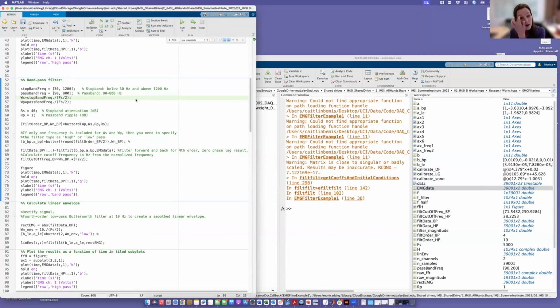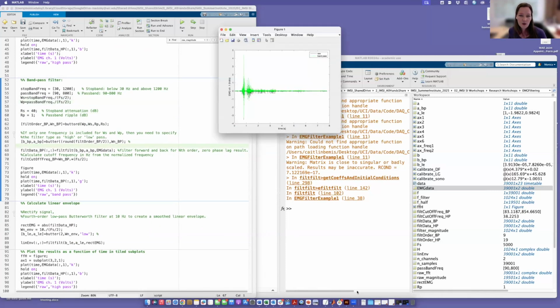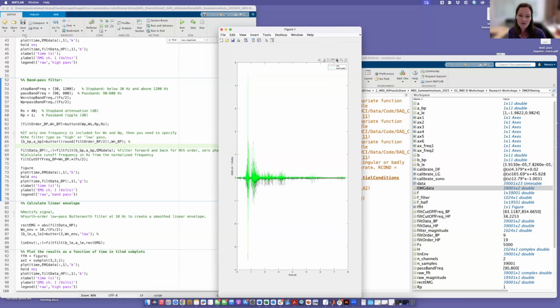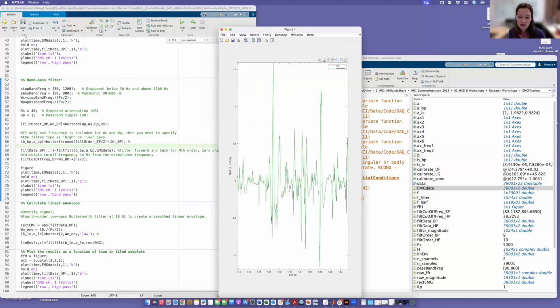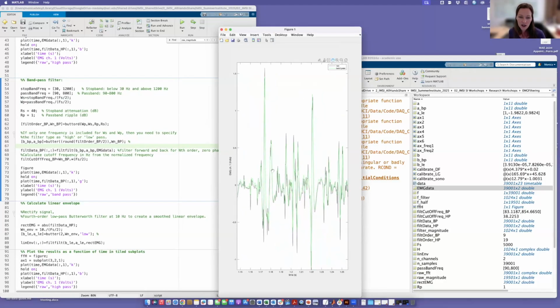Which isn't terribly surprising, I suppose. Right? They are smaller. Okay, so I'm reasonably happy with this version, where it's mainly removed the DC offset of the signal. And if we zoom in here, even though it's attenuating some of those peaks slightly, it still retains the overall characteristics of the curve, right? So that's what I'm looking for there.